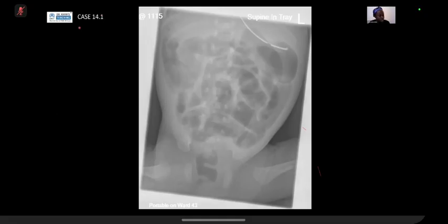What I also look for is change over a series of radiographs. So if this child had 3 abdominal x-rays and they all looked like this over a period of the day or 2 days, and the bowel gas pattern wasn't changing, that to me suggests that there's sluggish peristalsis, the bowel is not happy, and that also raises the possibility of necrotizing enterocolitis, even if I don't see all the other findings that I would typically see.